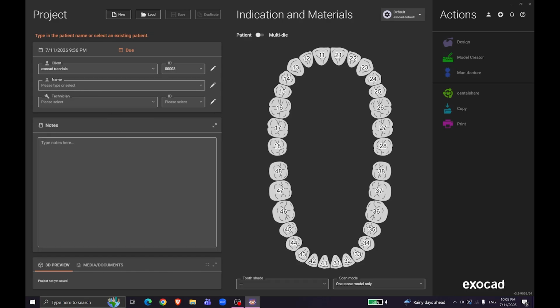Alright, that's very easy. And then here you're gonna write the patient's name. In this case it's gonna be first video. Now you don't have to add a new one.